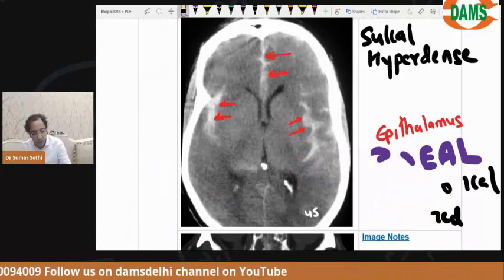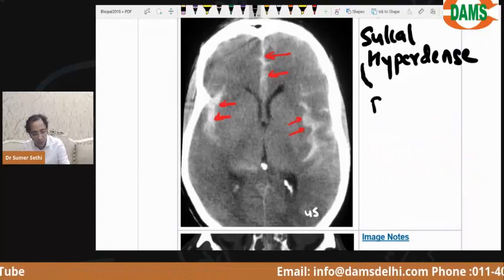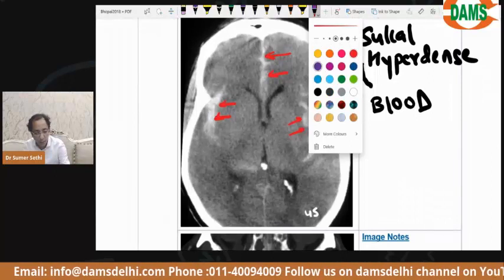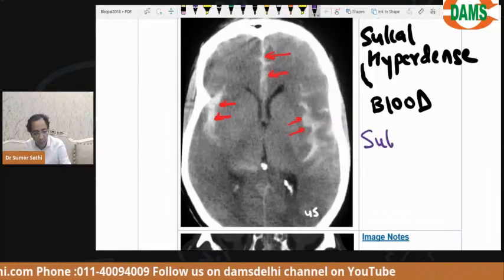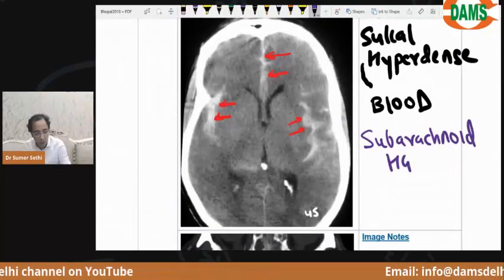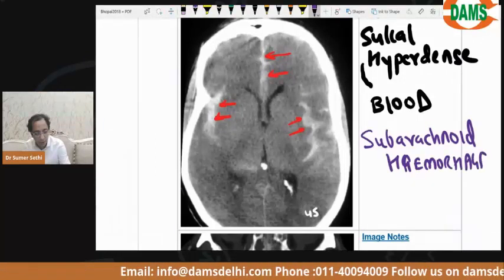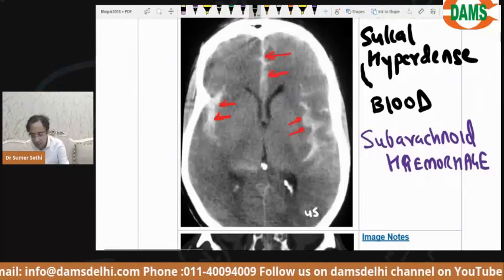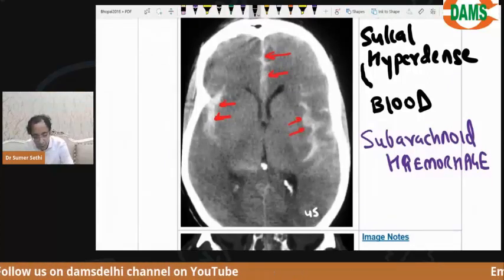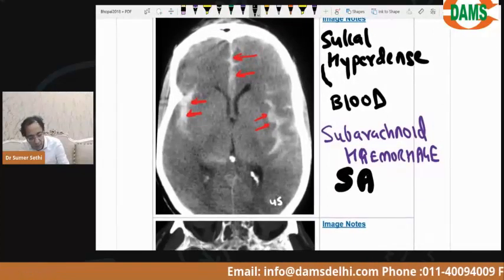बच्चे सोचें sulci hyperdense क्यों होंगे? यहाँ तो CSF होना चाहिए था. CSF should be dark, but this is white because you have blood. So if you have blood in the sulcal spaces, that means you have blood in the subarachnoid space. And this is what is called subarachnoid hemorrhage. Are you clear with this or not? समझ आया कि how to differentiate between different kinds of hemorrhages? Now we can see there is blood in the sulci, and that is called subarachnoid hemorrhage. In short form, we will write it as SAH.